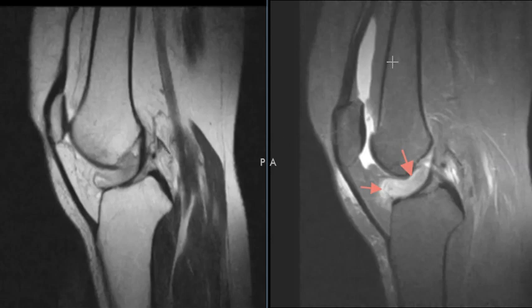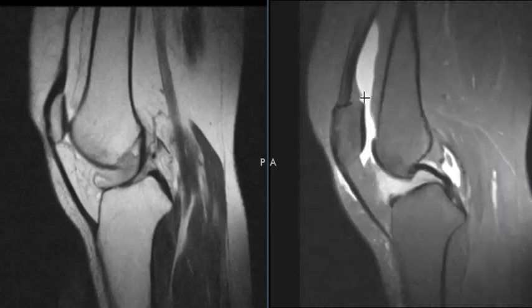It's actually called a sagittal view, but it looks from the side. We can see the knee in profile like a lateral x-ray, and this sagittal view of the knee shows the femur coming down here. We see the arrows pointing to the abnormality, which is between the femur and the tibia down below. To the left we see the kneecap, the patella, and the patellar tendon coming down here in the front. This is the quadriceps tendon here, and we see this white stuff here behind the kneecap.